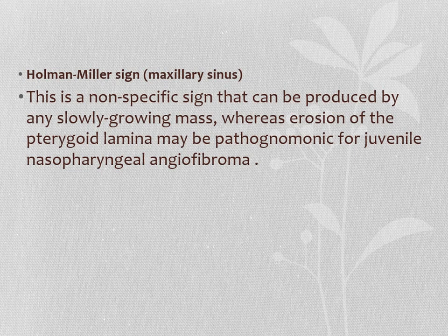So, what are the other things that can help you decide this is a juvenile angiofibroma? The patient should be male, must be male. Usually adolescent, teenage, usually presenting with recurrent, severe epistaxis. Radiologically you have the Holman Miller sign first, second, the location, the sphenopalatine fossa, and it is highly vascular, with marked contrast enhancement.